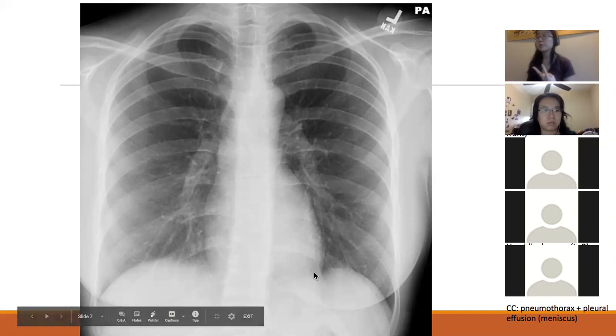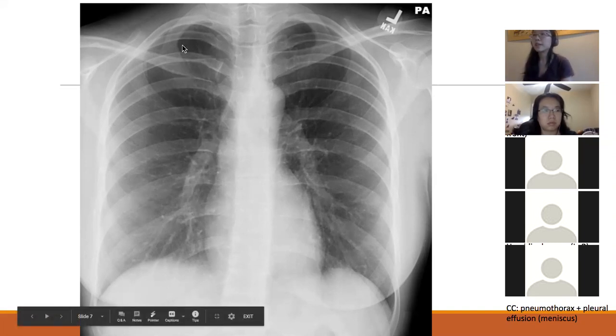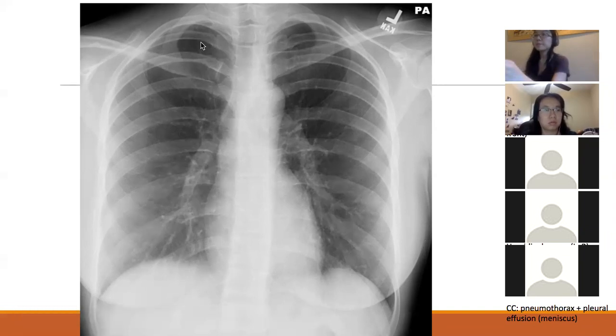So there's two types of pneumothorax that you're responsible for. And the first one is the spontaneous pneumothorax. So what that's going to look like is, you're not responsible for how this looks on imaging. But basically, there would be some clearing of some of these bronchi because the lung collapsed, right? So this space would be pretty dark because there's no tissue, there's no vessels in that space anymore. It's just straight up air. So this is like a spontaneous pneumothorax, right? And then because that lung's collapsed, there's extra space in the lung cavity on that side.